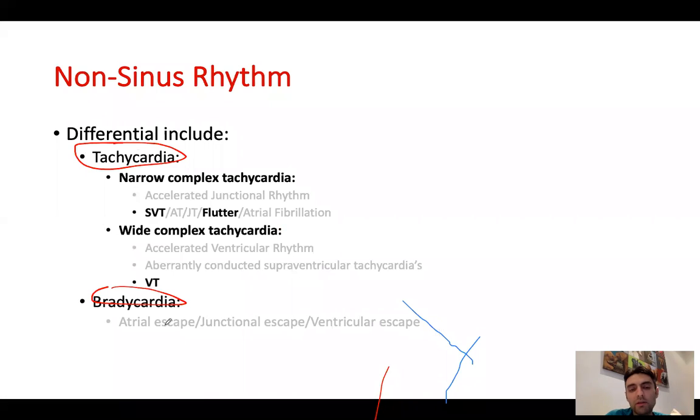And if you're bradycardic, then usually you have sinus node disease, or you have someone with heterotaxy without a normal sinus node, and hence the atrial activation is coming from elsewhere.